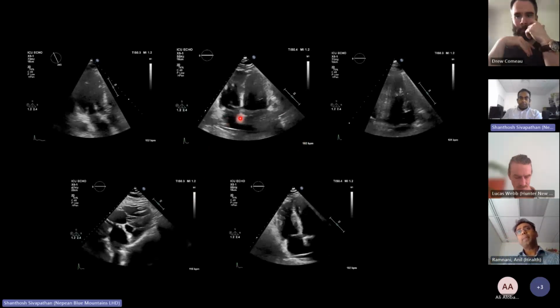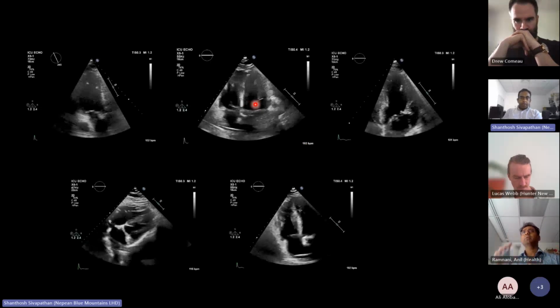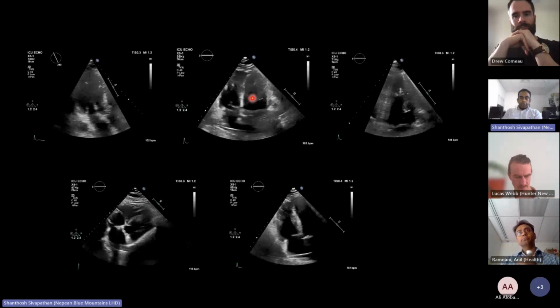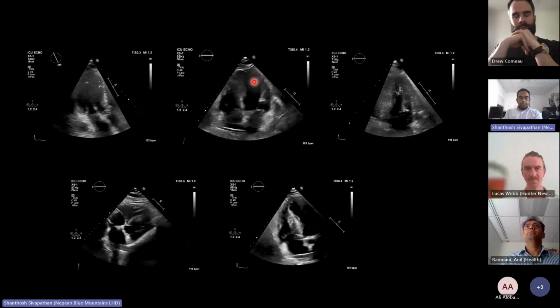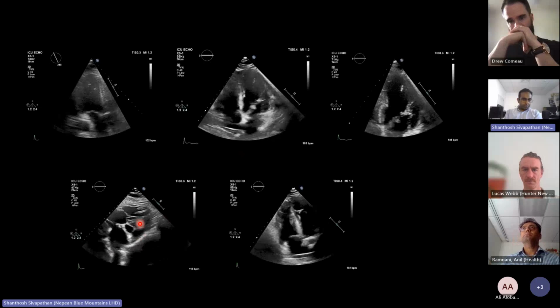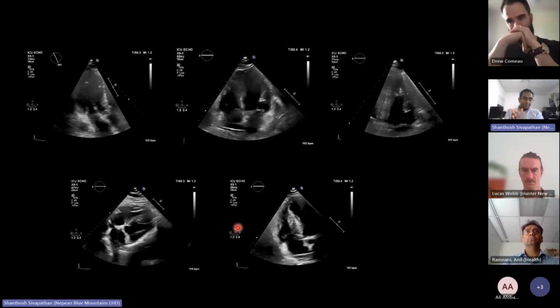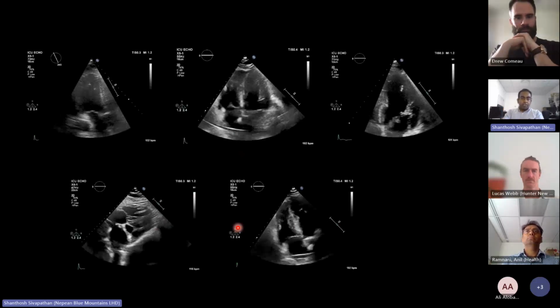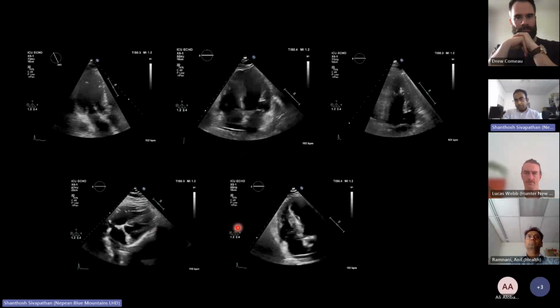So just to summarize, there's a couple of points that you've highlighted. What we were talking about is, can you see my laser pointer there? Where my laser pointer is, you can see both of the LV walls, both the septal walls and the lateral walls, are almost coming together, and it's more obvious in the subcostal view, where it was kissing. And that's a good sign. That's a sign that the LV is likely underfilled, or we're really hammering this guy with catecholamines.